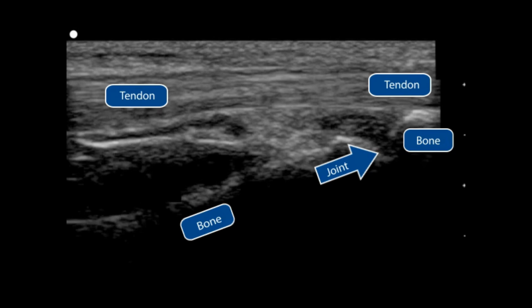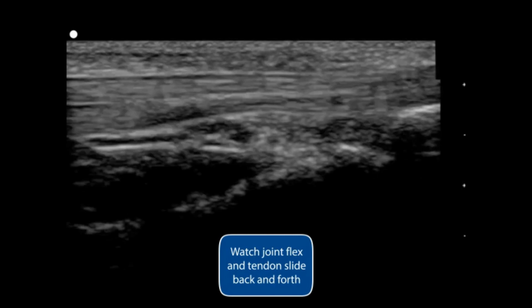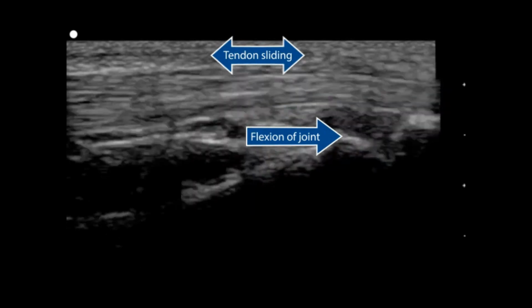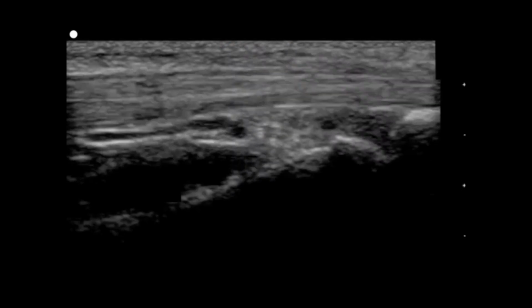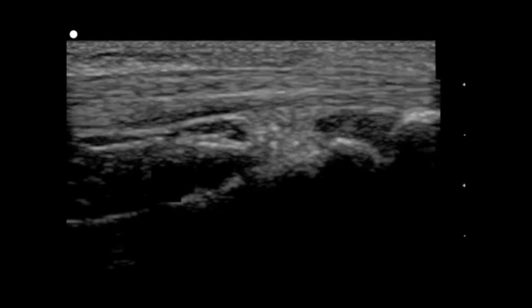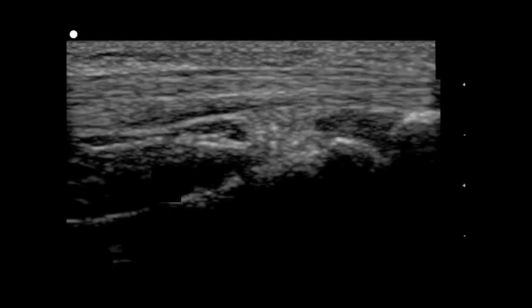Musculoskeletal ultrasound is also unique in that it heavily relies upon dynamic imaging. One can have the patient actively range his or her joints under real-time ultrasound imaging. This will enable dynamic visualization of tendons, ligaments, and muscles as joints are taken through standard ranges of motion. This can help identify pathologic conditions that otherwise would be difficult to detect using static imaging.